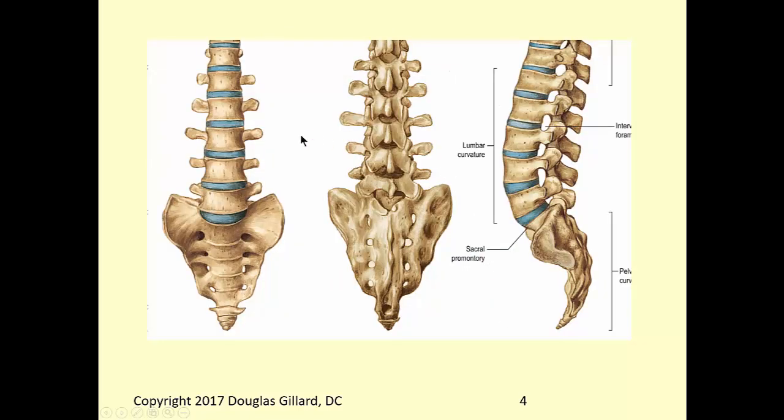Let's do some parts here in this nice drawing. So what's that? L5 vertebral body. What's that? L4 vertebral body. What's that? I know it's the intervertebral disc. Which one? Whoever sits on top of the disc conquers it. That's L4, so that's its disc. It's conquered it. L4 intervertebral disc.